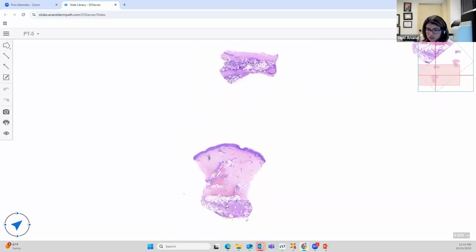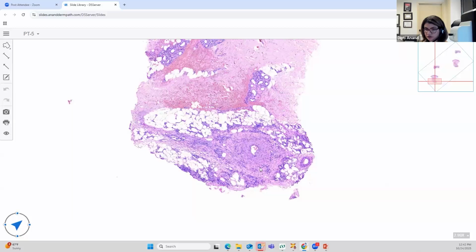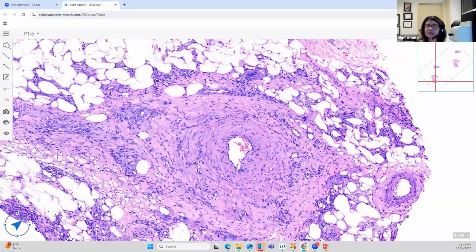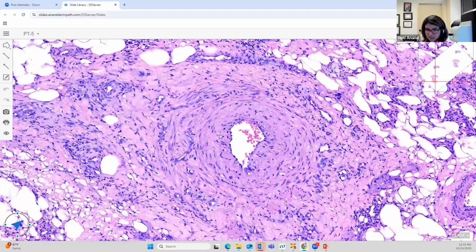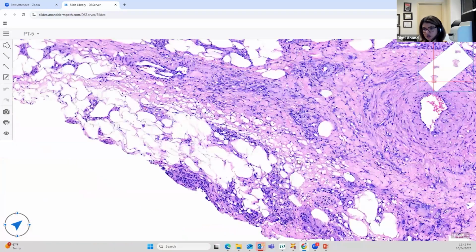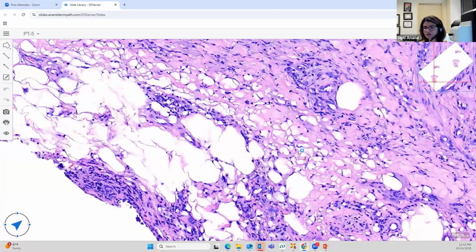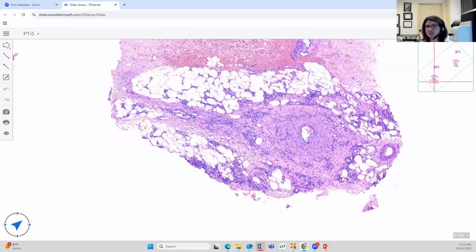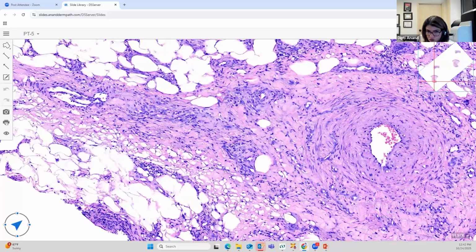Please remember, in erythema nodosum, you can have spillover of inflammation to the adjacent lobule. And sometimes a vessel may secondarily get trapped in the septal fibrosis. So it may mimic something like polyarteritis nodosa. So be careful in recognizing that. As we will see in PAN, you will see vessel destruction. There is no vessel destruction here. This is just a normal vessel which has been caught up in the septum. And you can see that there is periseptal lobular fat necrosis. You can see this dying fat, but it is right adjacent to the thick septum. So this is erythema nodosum. Okay.